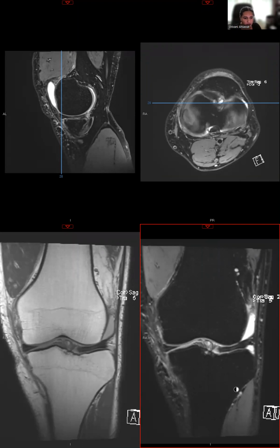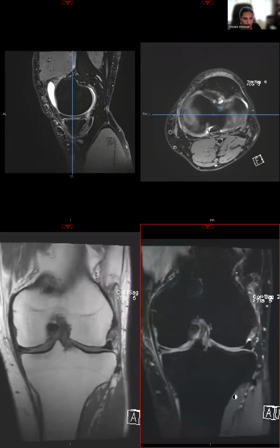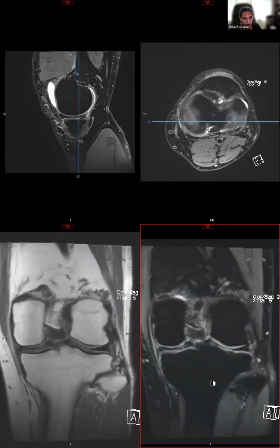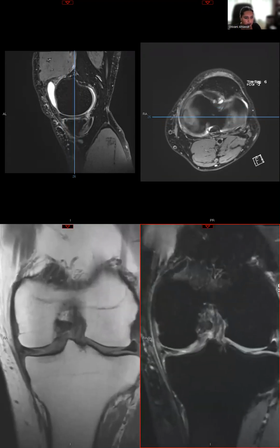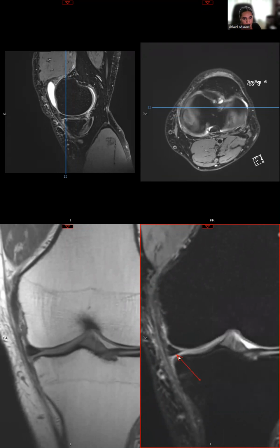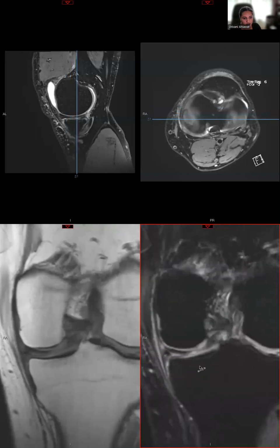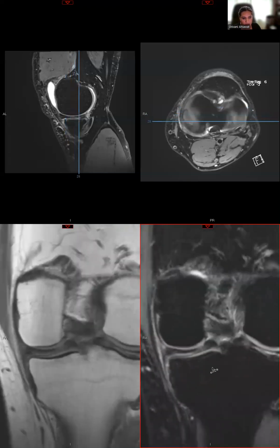This is a slightly older patient with clinically suspected medial meniscal tear. And we see abnormal signal that extends to the inferior articular surface. So it meets criteria for tear on MRI. It is, for the most part, an incomplete, predominantly horizontal tear. But what I want you to note here is if we start from the anterior aspect of the body, it's pretty smooth. And then as we scroll posteriorly, you'll see a displaced fragment. So a very small flap. This would be a horizontal flap tear with displaced fragment in the meniscotibial recess.